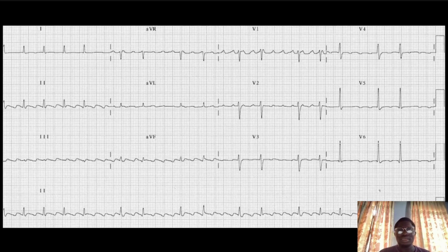I saw this ECG case I found quite interesting, and I just felt it would be cool to share it with you lovely folks on the internet. So, you have a standard 12 lead ECG on your screen.